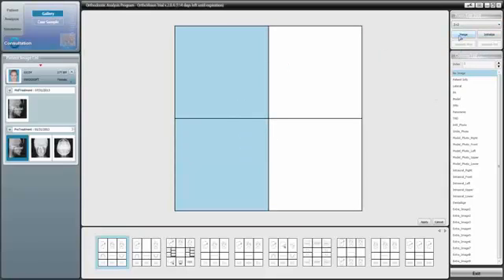If you click and drag across multiple cells, we can merge them by simply clicking on the Merge button, or initialize to reset back to where we were. We can also separate each box by simply clicking on the Separate Row or Separate Column feature. When you're done, simply click on Apply.